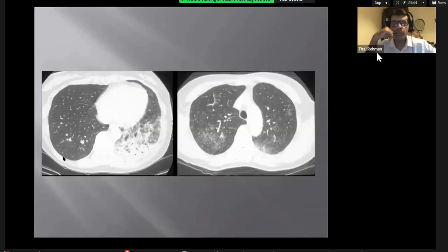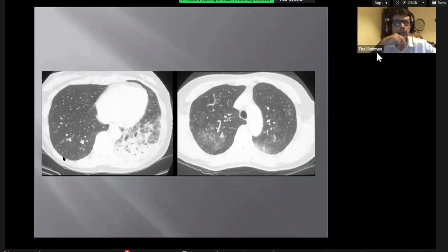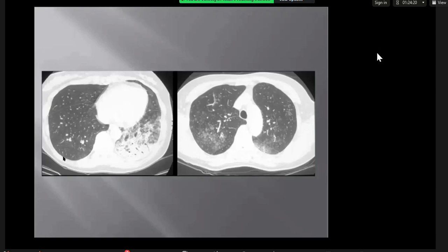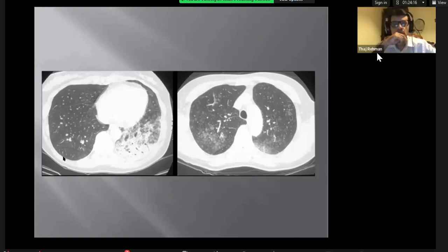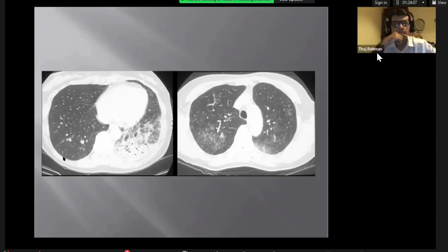Which eosinophilic pneumonitis will appear like this? EAA can give you... Allergic eosinophilic... Okay. That's one of the differentials. Other differential here, since it's patchy and ground glass, I would be keen to see lymph nodes here as well. Okay, there were no lymph nodes in this case.